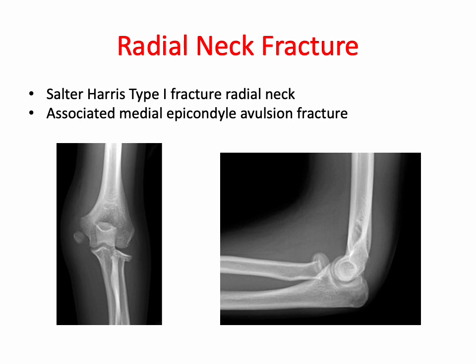So here we can see a Salter-Harris type 1 fracture of the radial neck and an associated avulsion of the medial epicondyle.